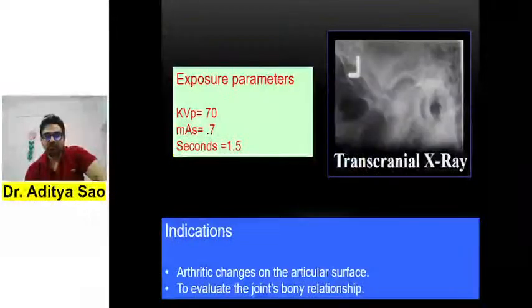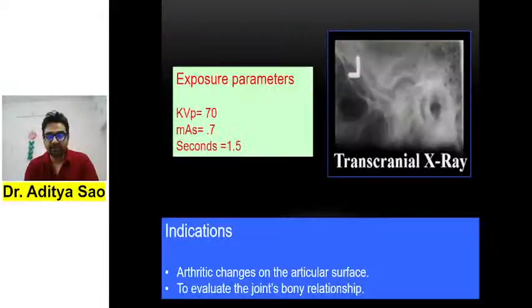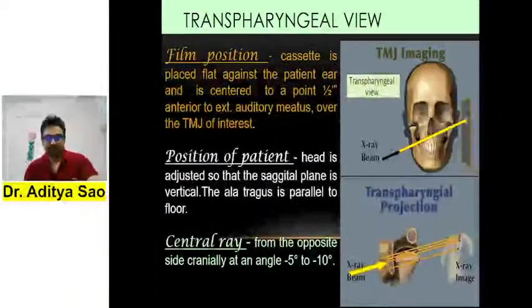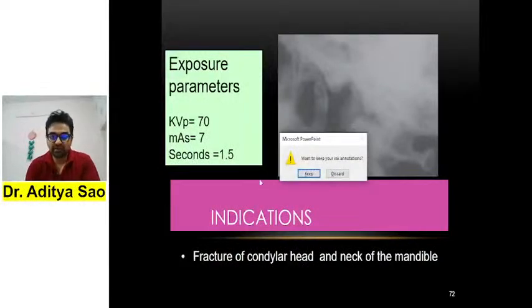Next we are going to talk about the TMJ views. The TMJ views are very clear. I am going to show you the TMJ views.